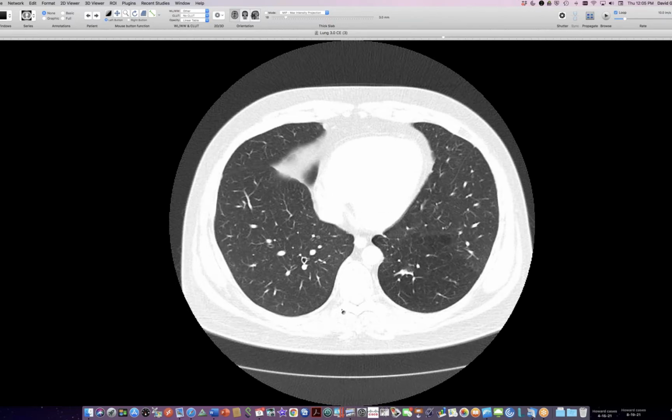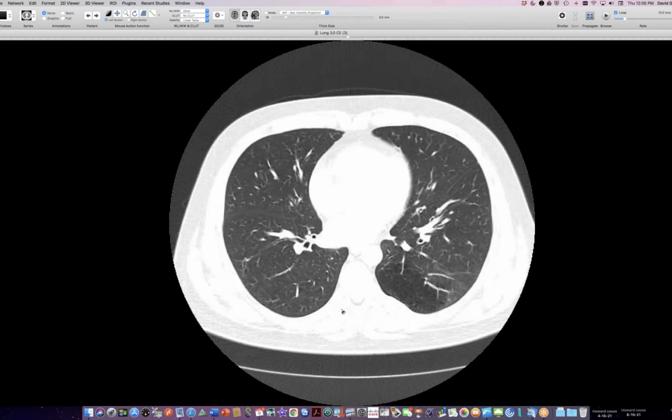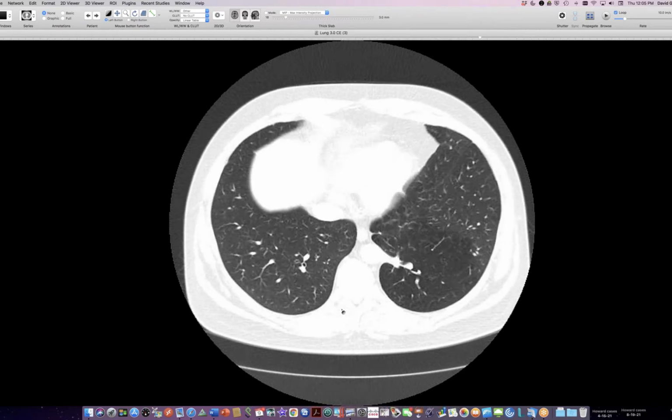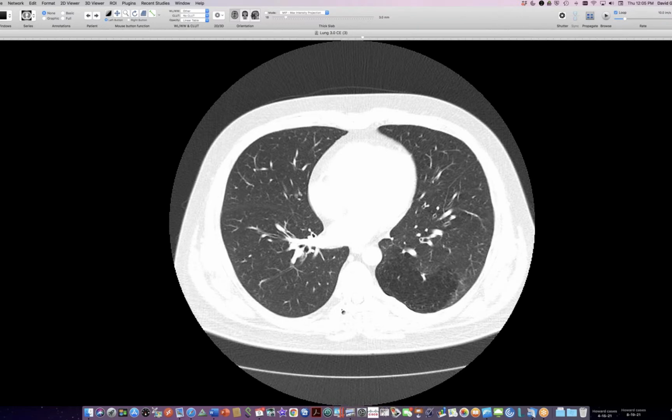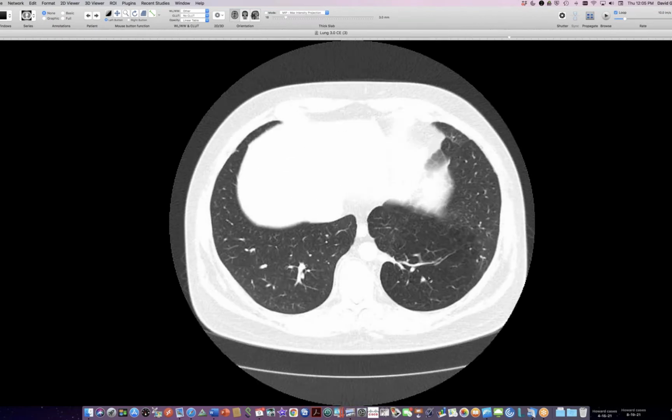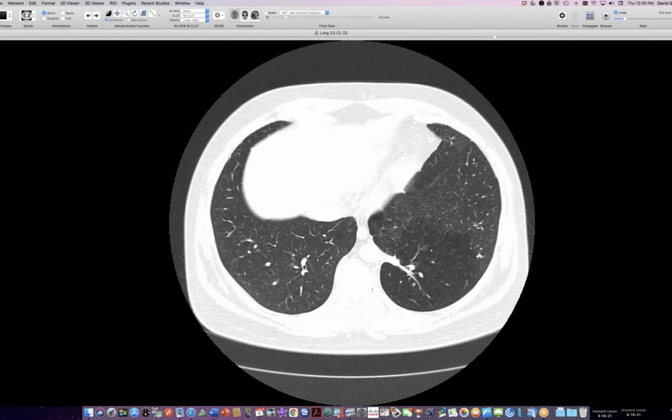Would you call that a CPAM or lobar emphysema or something like that, or overinflation, or call this a hybrid lesion, or just consider that sequestration can have hyperlucency as part of it. I've often seen a cystic abnormality in the center and then the lucency around it.